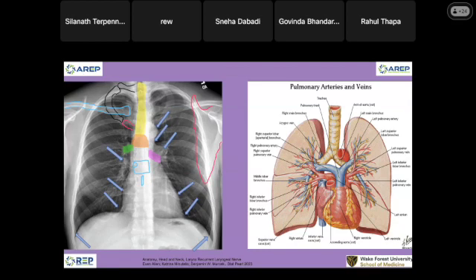And JP, my colleague, will give you a session on how to read chest radiographs on PA and lateral. We're not going to go there here. This is the trachea, the tracheal air column. This is the left main bronchus, the right main bronchus here, the right upper lobe bronchus here, and the right tracheobronchial tree.